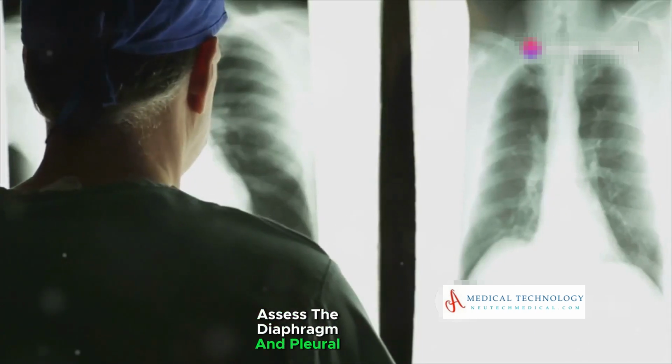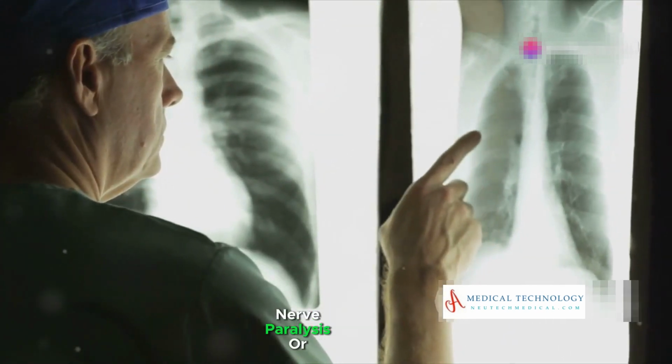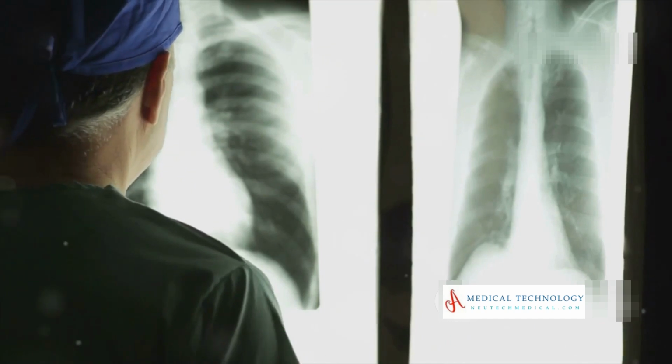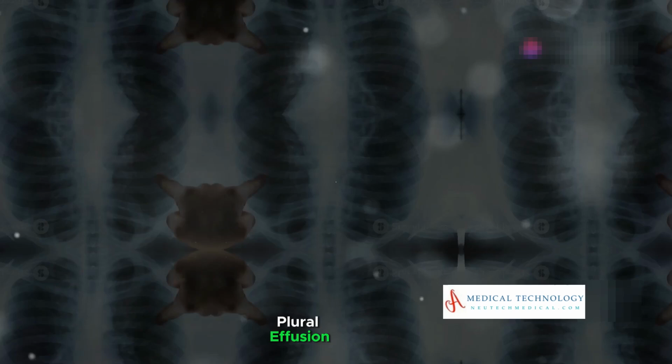Assess the diaphragm and pleural spaces. Diaphragm: look for elevation, which can suggest phrenic nerve paralysis, or flattening, which can indicate hyperinflation as seen in COPD. Costophrenic angles should be sharp. Blunting can indicate pleural effusion.